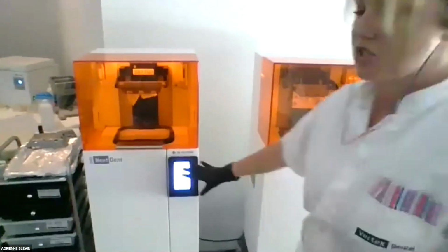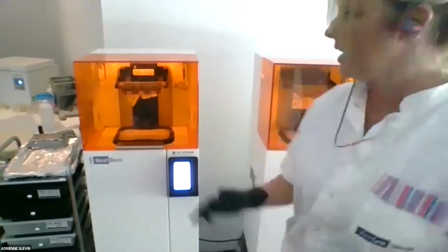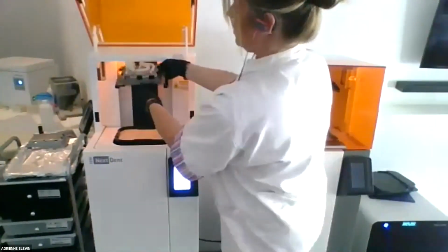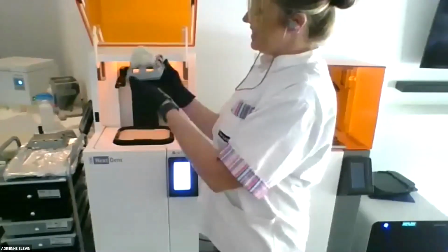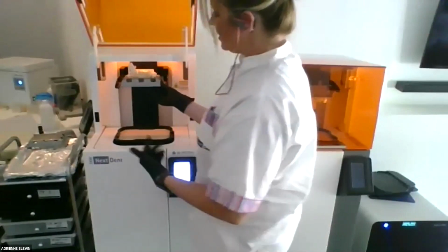So what I'm going to do is start the printer now. It's all over here at the printer, and you can't really see the screen because of the light. But the print I just set up is an hour, and I have already printed it a few minutes ago. It only took 3 minutes. No, I'm just kidding. So anyway, this build is done. So we're going to clean that up real quick, and we're going to start our new one.